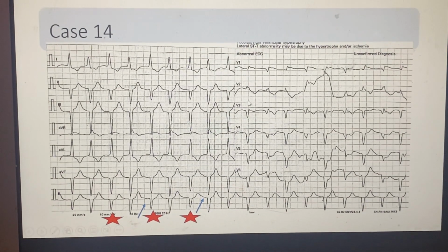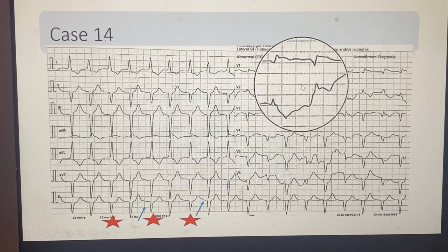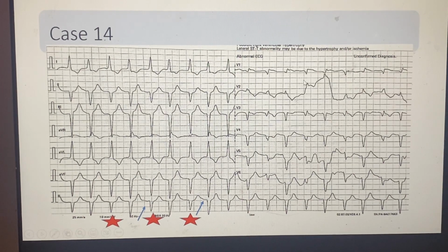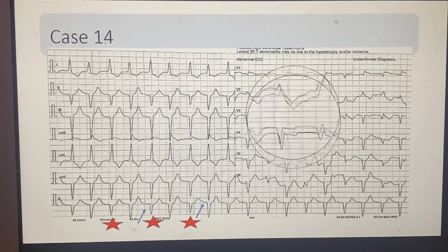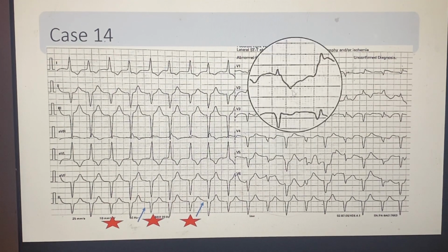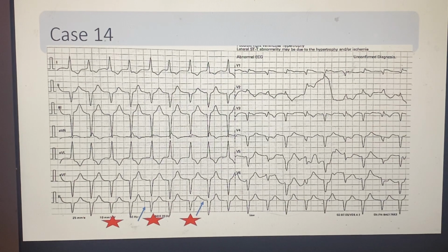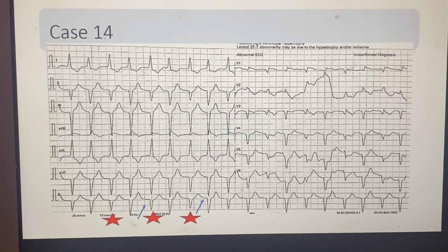it is considered true or not, but I think the QS is relatively approaching the criteria, but it's almost concordant. It's just like a pattern break, where it's negative, positive, negative again. So I just wonder whether it is. Based on that, I think it's more toward VT. But again, open to discussion.